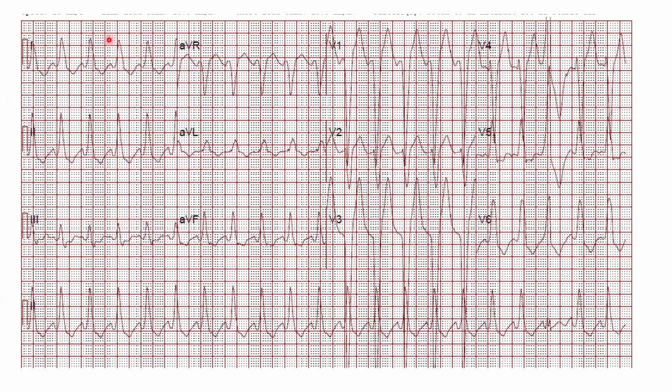When the QRS is up in those leads, 1 and aVL and V5, V6, ST will be depressed. So imagine somebody has left bundle branch block and anterior ST elevation MI. He inherently has ST elevation from the left bundle branch block. How to know whether within that ST elevation there is also hidden a STEMI type of ST elevation?